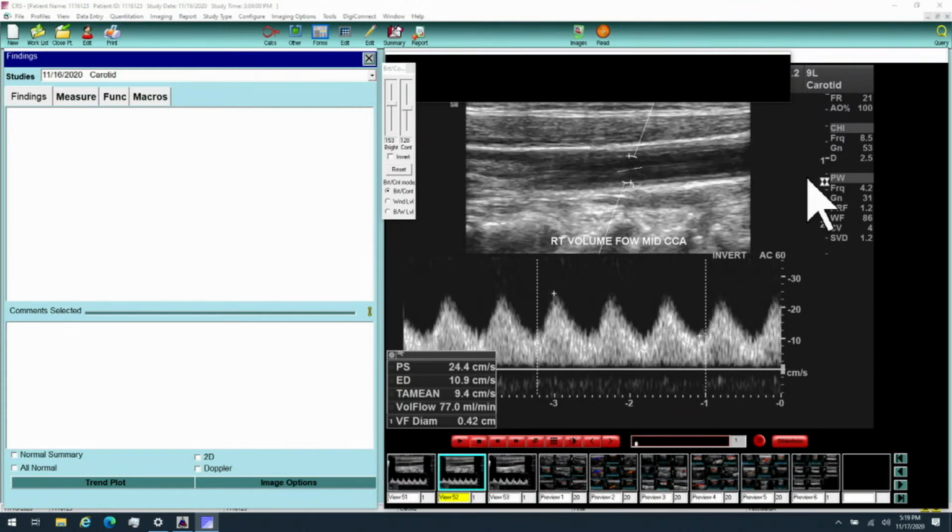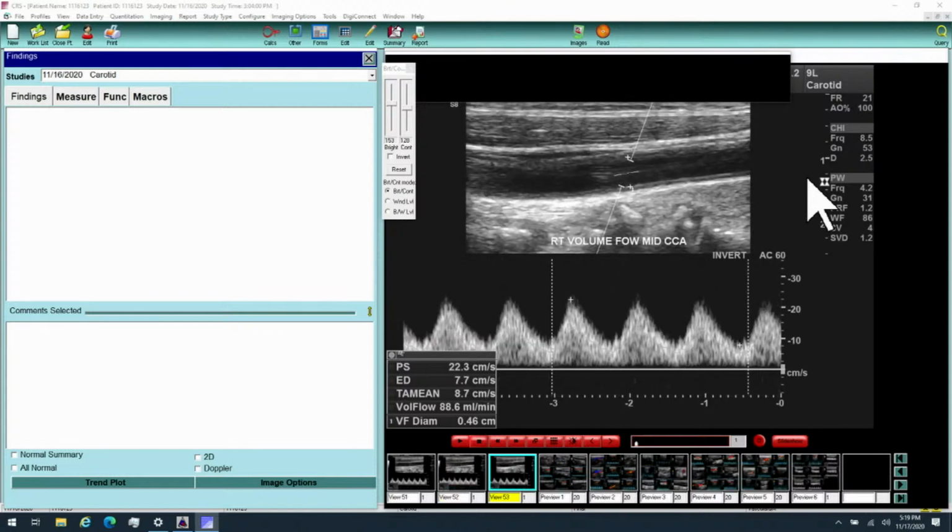So I think the two pictures tell you the difference. And again, what I think is really interesting is that if I would notice the scale, because your scale is so decreased in the right common carotid, I suddenly wouldn't see the difference between the two waveforms. But the volume flow is a stunning difference. So I think that's the end of it, and there's one more picture, but let's go through the interpretation. I would love to see the easy part.